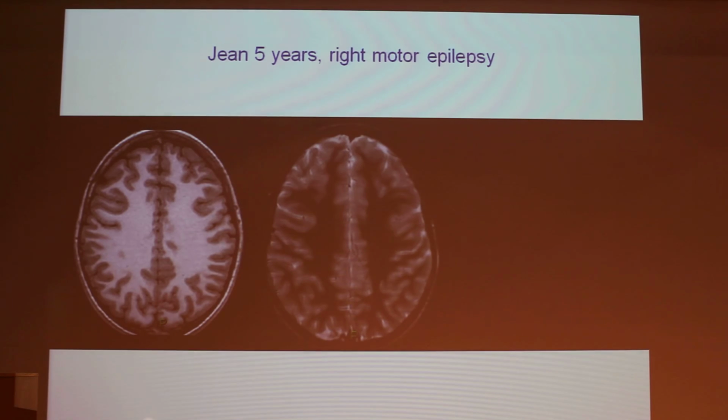So, just to finish, Jean, 5 years old, right motor epilepsy. What do you think? What do you perform? You don't see anything.